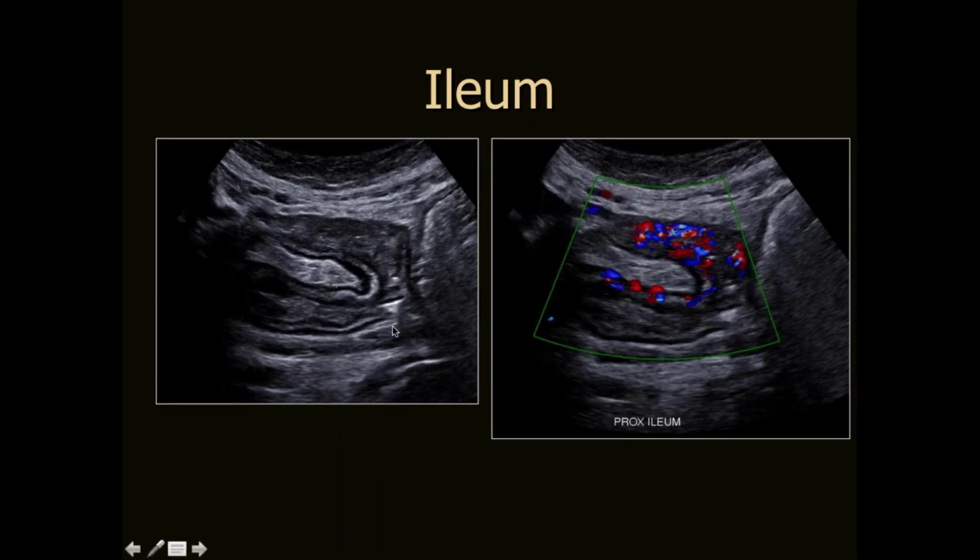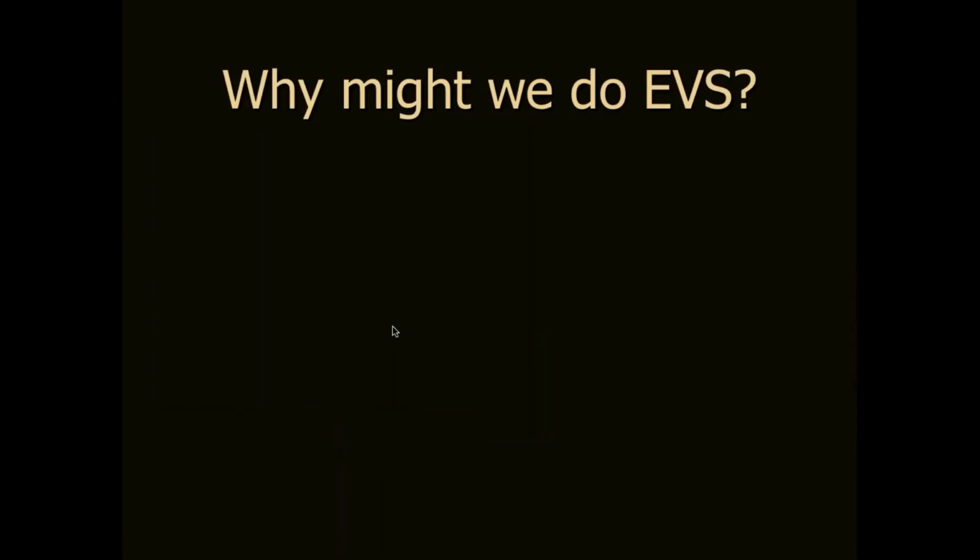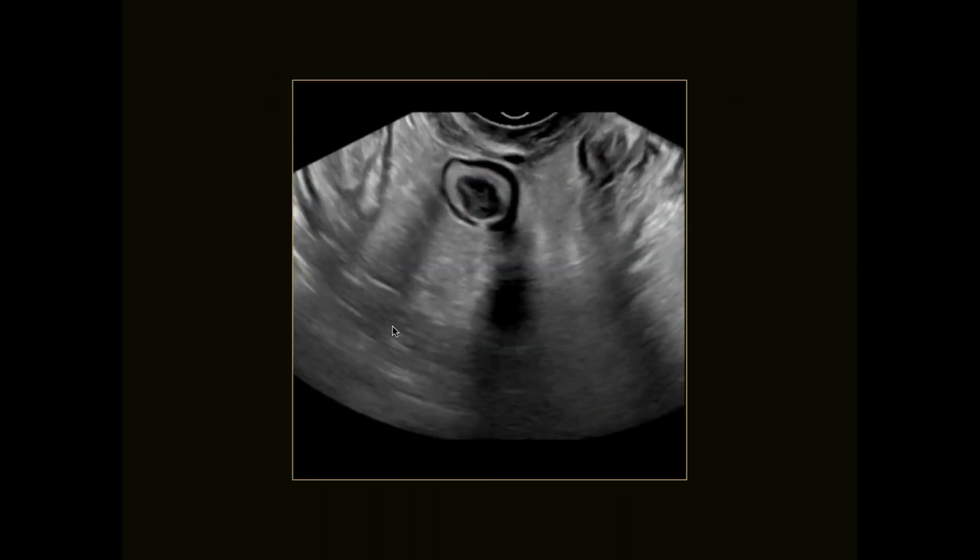And so what do we do in my department? Why might we do an endovaginal scan? Well, we have a very low threshold for performing endovaginal sonography, in that over the many years that I've done imaging in patients with inflammatory bowel disease, there are so many patients where we've seen striking pathology on endovaginal scan that we don't see on the suprapubic imaging. And so let's look at this lady.